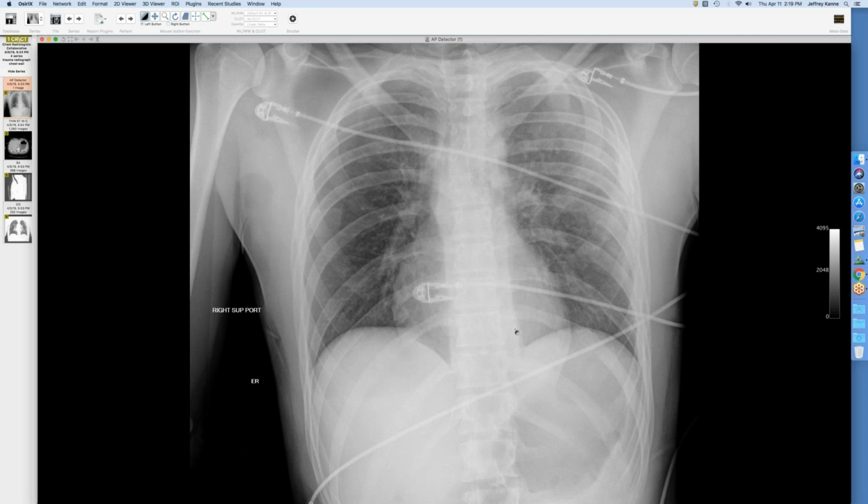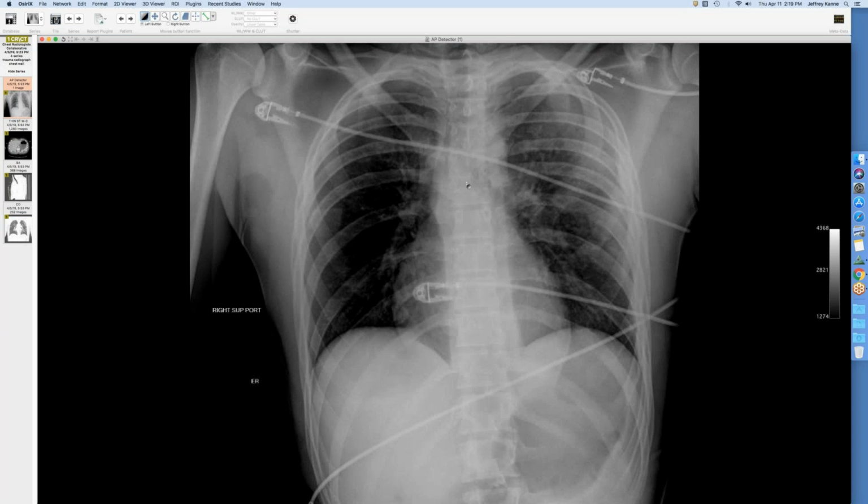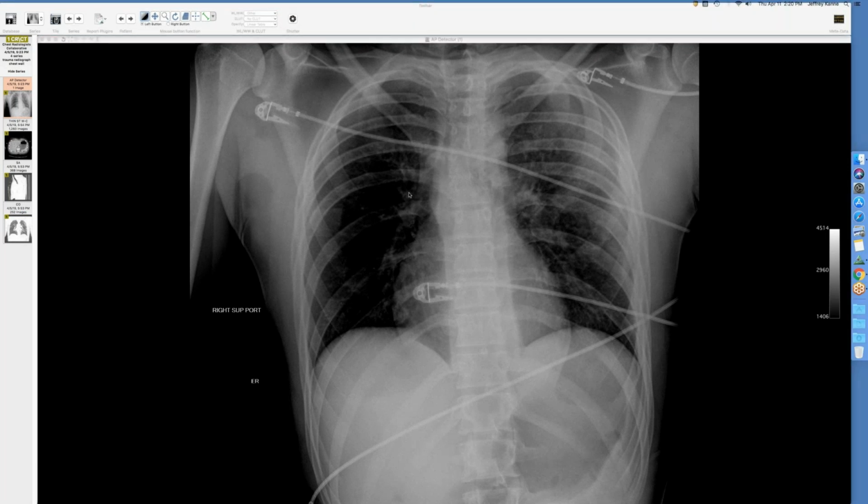Usually in a thin young person like this, there's not this much soft tissue along the paraspinal lines, because it's just mostly a little bit of fat and bone. And then you also notice up in this area that it's kind of difficult to see the vertebral bodies. It looks like we may be missing a space here, but hard to say much else about that. But it's abnormal, so you have to worry about a hematoma, mediastinal, paraspinal.